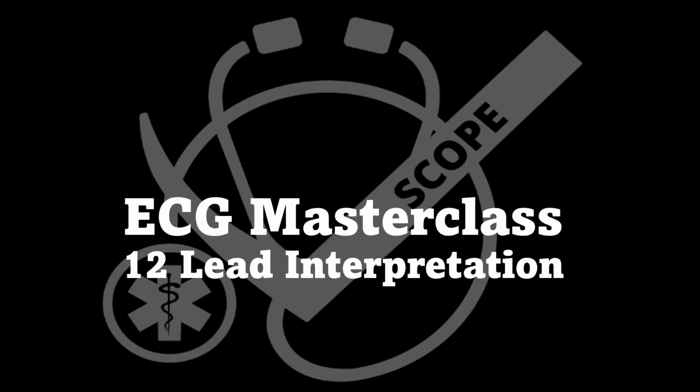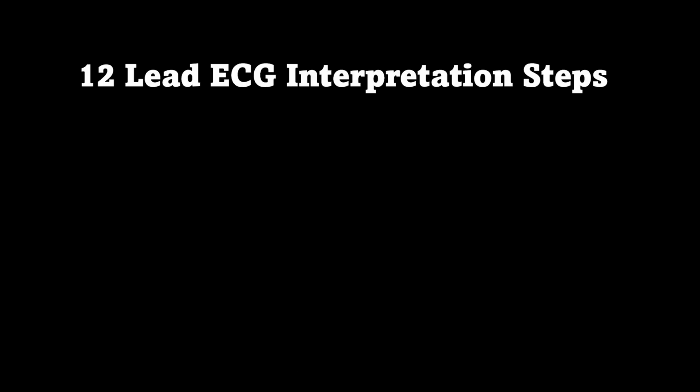The one tip I have for you is to constantly try to interpret every 12 lead you can get your hands on. Practice over and over, and at the end of the day, once you've seen it enough, you'll realize ECG interpretation is just pattern recognition. So without further ado, let's get into some 12 leads.